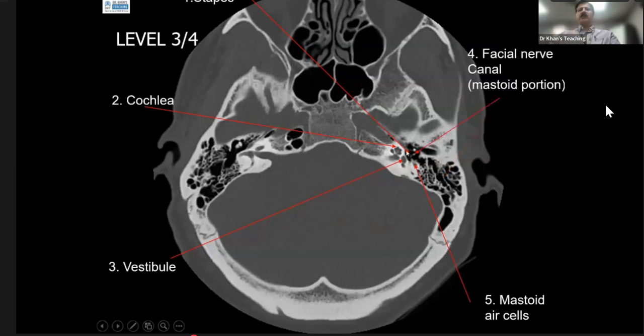I think this is a bit harsh for the simple reason, stapes, that I can understand it is not projecting very well for you, and the arrow is slightly off. So it's a bit harsh. So I think I'll disregard that. The point was that the stapes is visible here. And this flower, of course, is the cochlea. This thing is the vestibule.